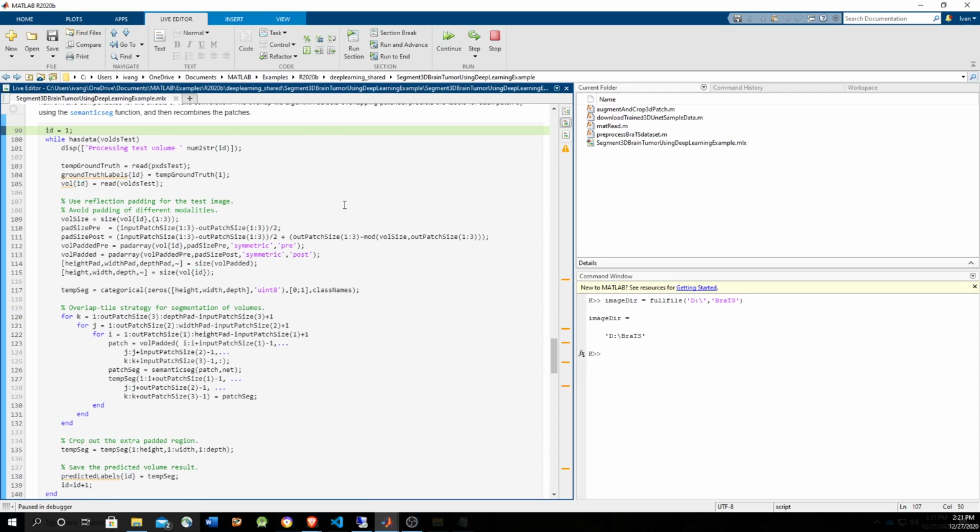One of the challenges, or tedious work, for deep learning is that you have to do some pre-processing, like we did before. Notice that the neural network was trained for patches. It was not trained for the full volume. So if you provide as an input the 3D brain image, we have to go through all the patches, get the corresponding output for each little patch, and then assemble a 3D output volume of the whole brain.